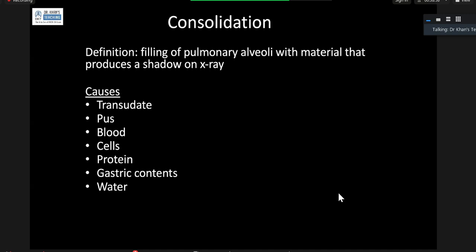The pulmonary alveolar, the bat wing alveolar edema that you just now saw is actually consolidation. When there is infection, pneumonic, bacterial pneumonia, that is again consolidation. Pulmonary hemorrhage occurs, the blood goes into the alveoli. That is again consolidation, right? So consolidation can be anything, right? And by looking at the pattern, by looking just at the chest X-ray, we may not be able to say the cause unless it's got a specific pattern. Like say, for example, the bat wing pulmonary edema, we know it is because of cardiac failure.